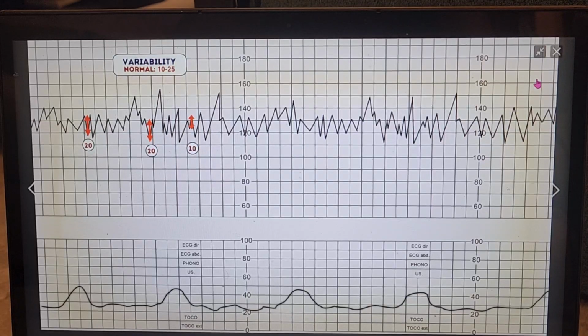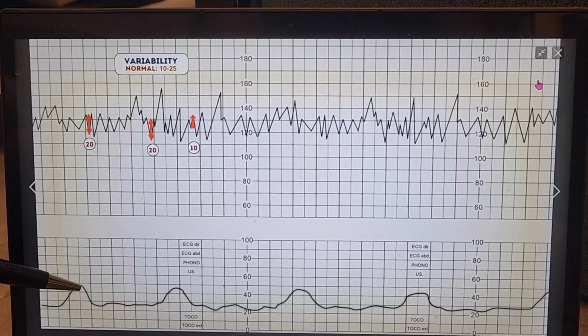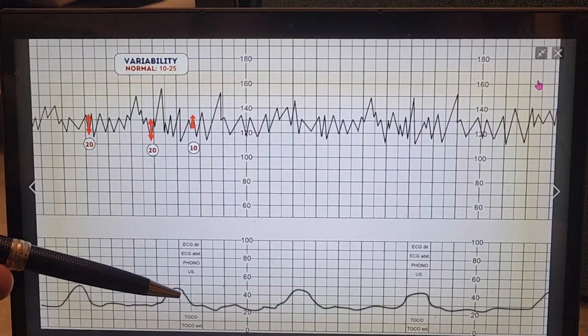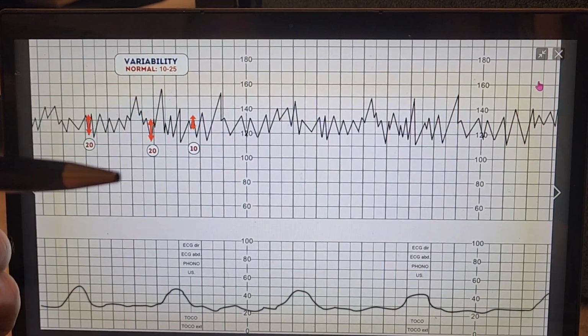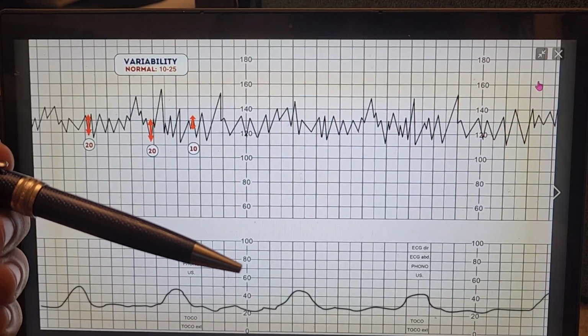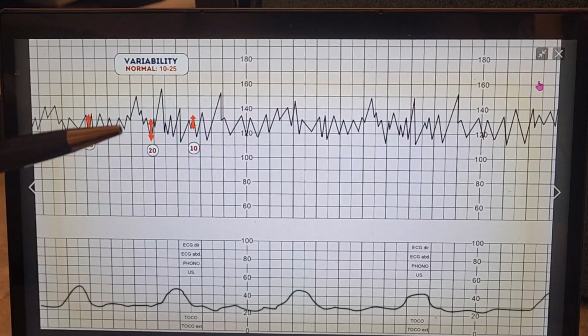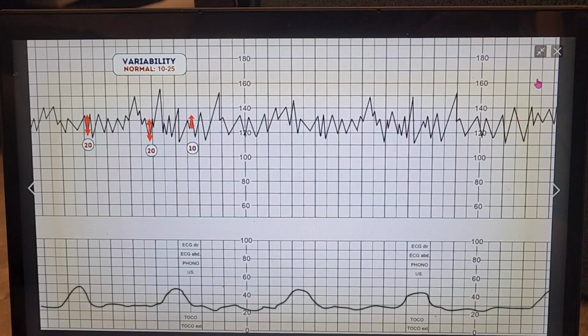If it's 200, it's considered adequate, which is effective labor, which may cause cervical dilatation and progression of labor. Okay, so the Montevideo unit is the sum of the number of millimeters as an amplitude of all the contractions in 10 minutes, and that represents the uterine contractility. But as I said, if you want to know the magic number for effective labor, if it's more than 200. If it's less than that, you may have to use Syntocinon for augmentation or for stimulation.